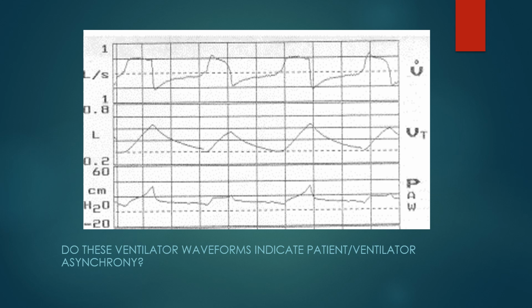So here we have a patient who is in SIMV with volume-controlled breaths and pressure-supported spontaneous breaths. It's not real easy to see that because these waveforms all look pretty similar. But if you look carefully, remember it's the fine details. This breath right here, the flow is constant all during inspiration, which looks like it's about 1 second. And then this breath doesn't look the same.